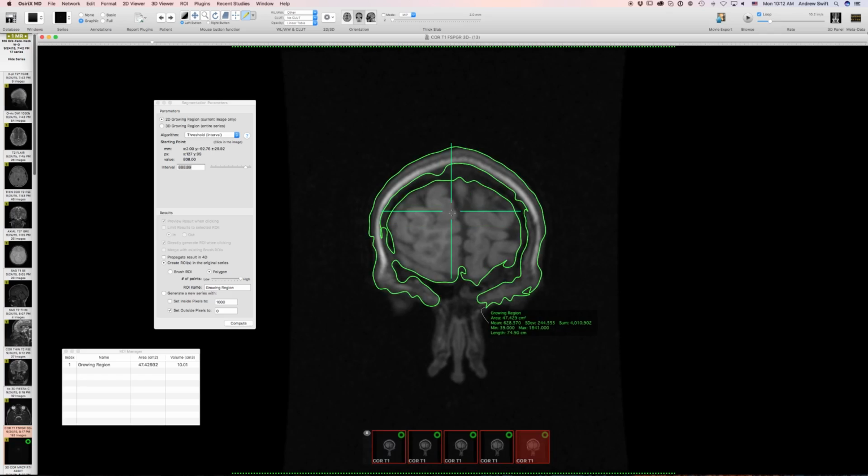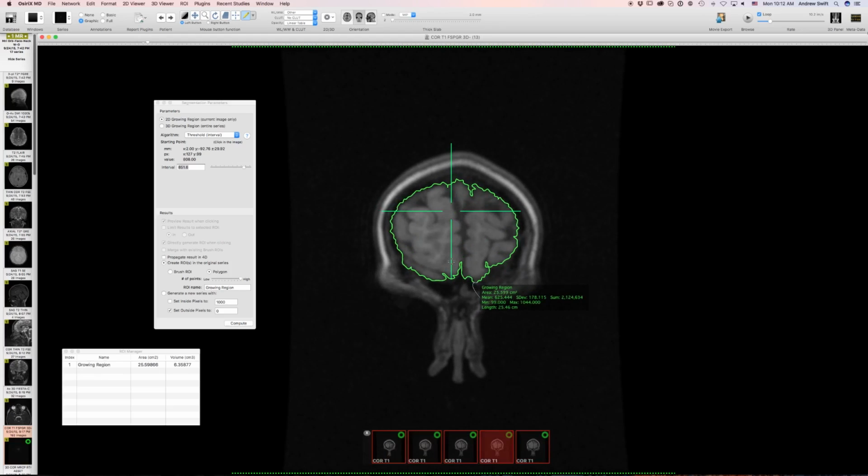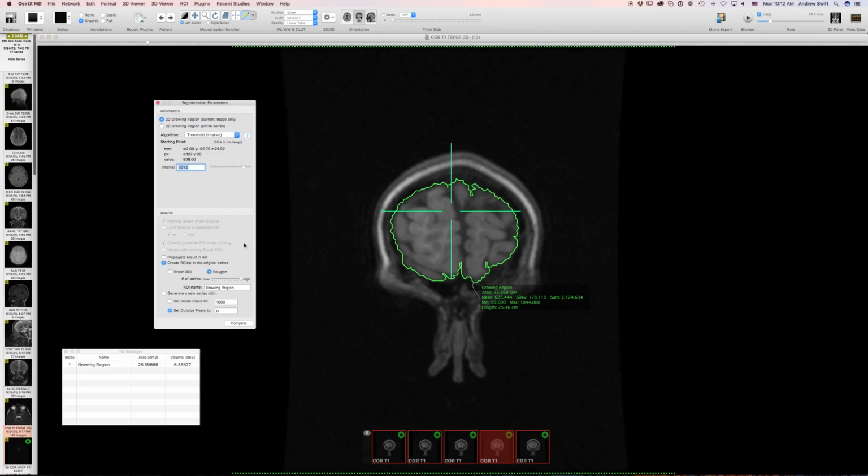So that looks good. So let's hit delete. Oh, see, I did it again. Click on the header, hit delete. Okay, that looks good. So this is the process, and this is what we've created. It's not quite as good as using the pencil tool that I show you in the other videos, but it's pretty close.